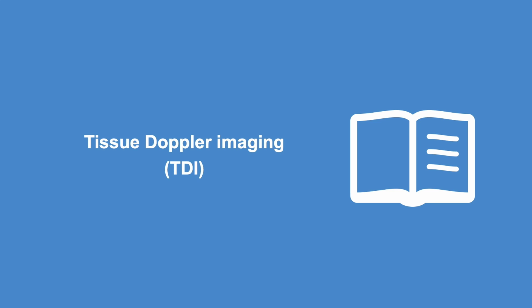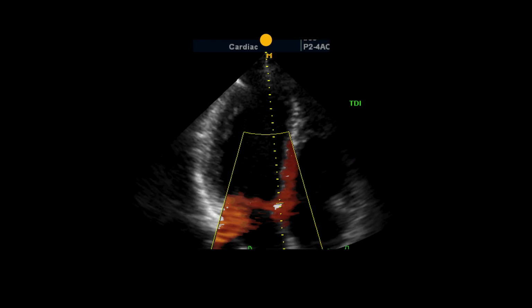In this MedMastery lesson, we will compare the use of these two foundational imaging modalities for strain imaging. Let's begin with tissue Doppler imaging, or TDI. TDI is an ultrasound technique that uses the Doppler principle to measure the velocity of myocardial wall motion, in contrast to traditional Doppler, which measures the velocity of blood flow.